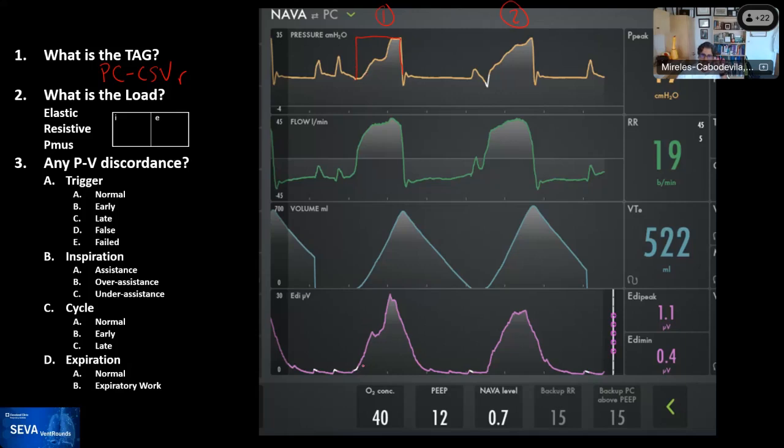So the signal from the electrical activity of the diaphragm, the ventilator is giving pressure proportional to that, and so you can see that this image of the electromyogram or electrical activity of the diaphragm is being mimicked there. You can see this shelf that occurred here, or this gradual increase with a shelf up here, occurring in both of these breaths. Rob, comments?